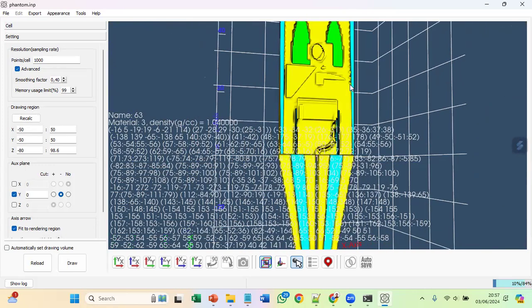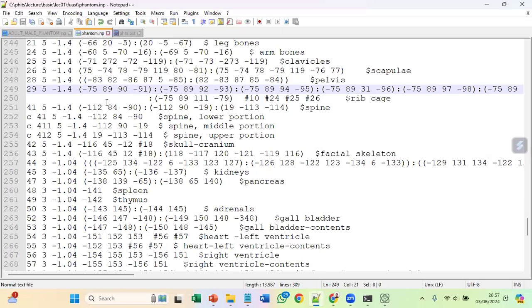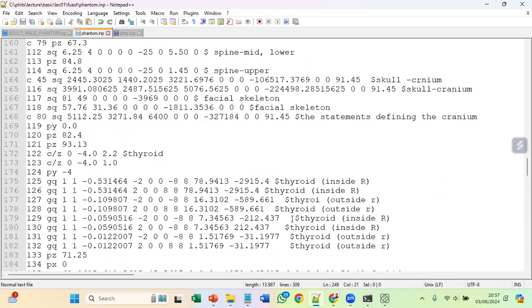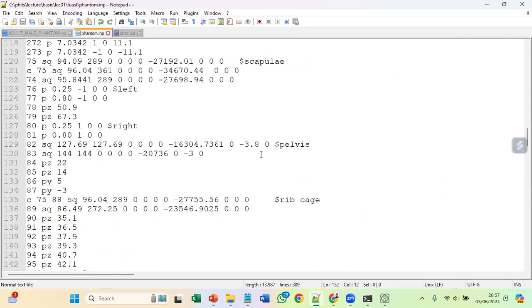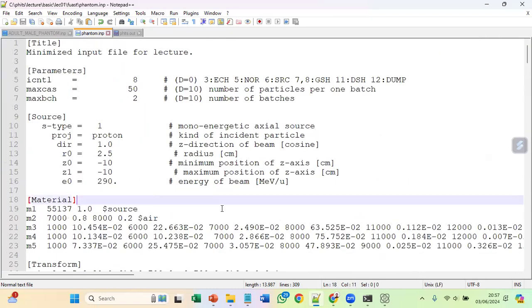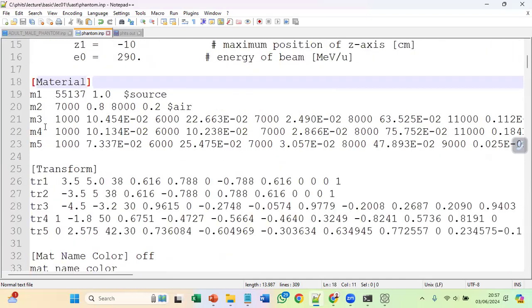Yes, sir. Okay, and I hope you guys try this by yourselves. But as a reference, I will also give you this code that we just copied. But I hope you create your own. Actually, there's a material in here already.